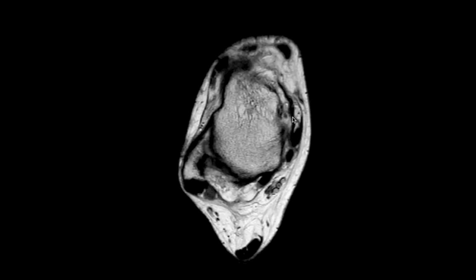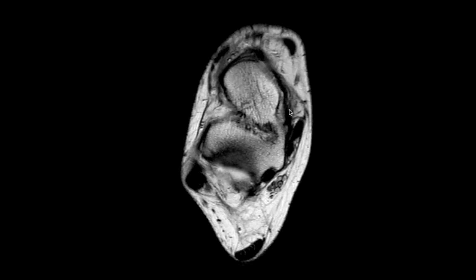The one that you can often track nicely as it travels lateral to the posterior tibial tendon is the tibial spring ligament, and that will then blend into this structure, which is again very, very important for maintaining stability of the midfoot and the arch.